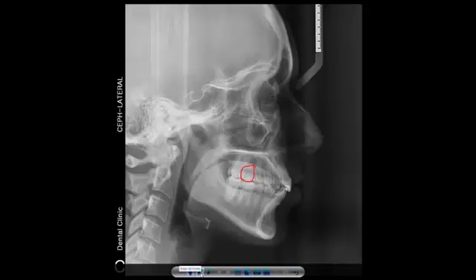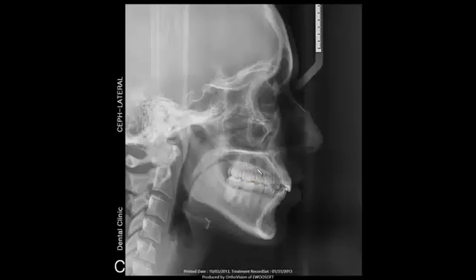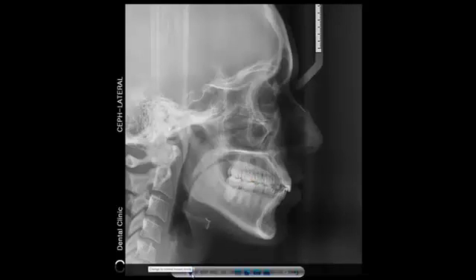It's in this full-screen version that we see most people start using the pen tool to highlight any areas of interest. To do so, simply click on the pen tool and draw directly on your screen to highlight any areas of interest. Beside the pen tools, we have the options to erase all lines or erase the last line that we drew. Be sure when you're done using the pen tool to click on the pen once again to return to normal mouse mode.